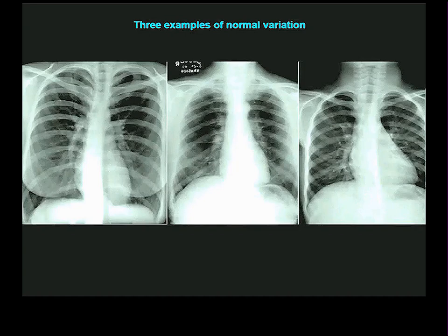Here, it's very, very clear. If this is the aortic arch here, this nice bulge is the pulmonary trunk. On this one, here's the aortic arch. This bulge, pretty obvious to me, but not as big as the previous one, is pulmonary trunk. And on this one, it looks to me like I want to call this pulmonary trunk. It's the only thing I think that could be. The little concavity right here, left auricular appendage. Right here would be the little concavity of the left auricular appendage, and right there. And then the big, long, bulging thing is the left ventricle.